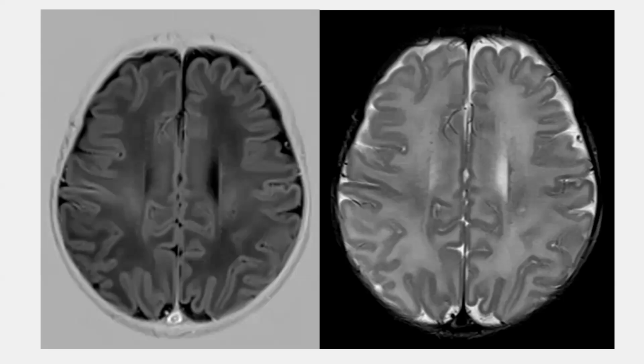Let's examine the brain of the newborn child. This newborn child, still a bit higher up, here we see mostly unmyelinated white matter, except for this region. Here we see some patchy signal increase on T1 weighted images and signal decrease on T2 weighted images. What is this? What are we looking at?